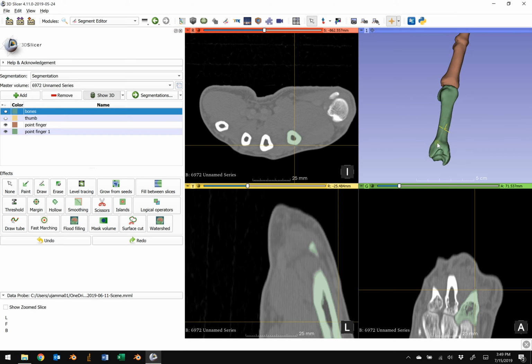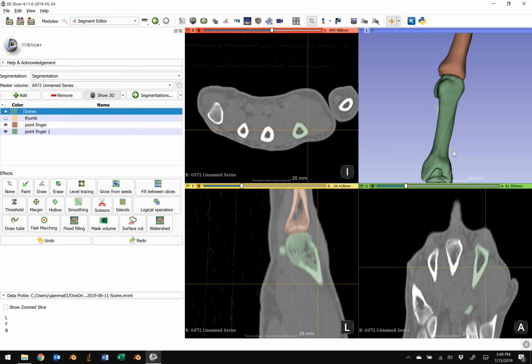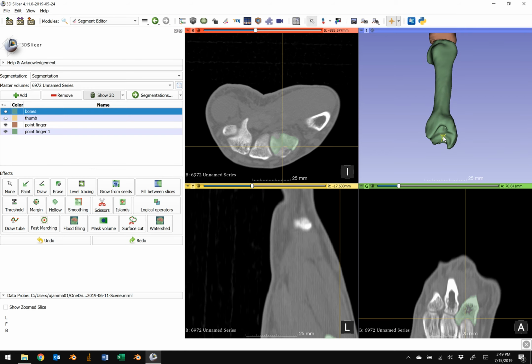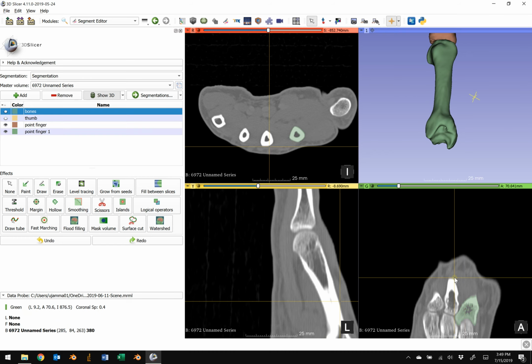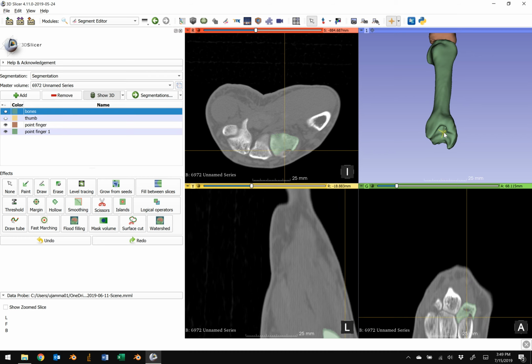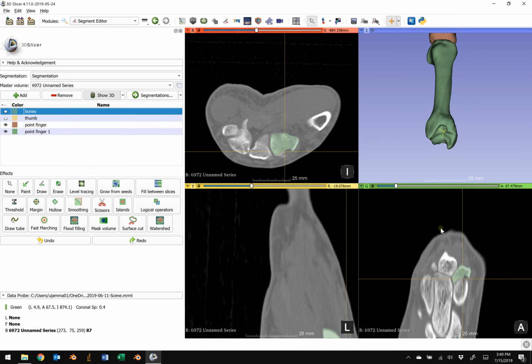If you look at the bottom of the joint there, you can see it's not a flat thingy. Instead it's like so. If you see here, as I've said in our meeting last time, you need to look at all three slices to get an idea of what I'm talking about.